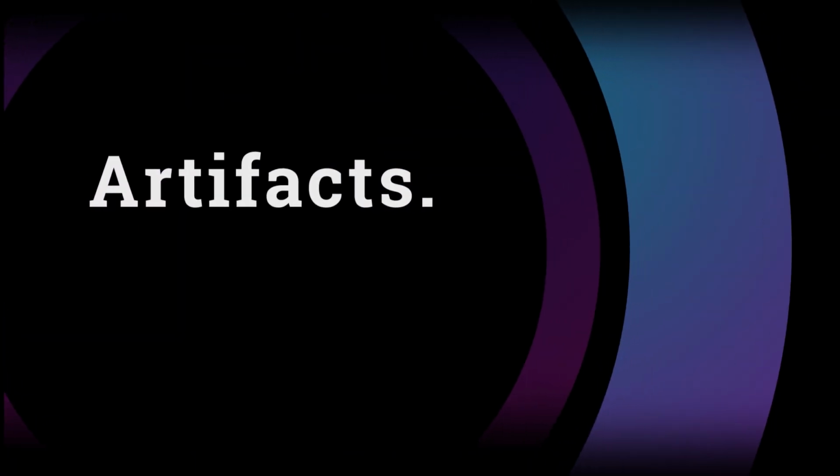Artifacts are any perceived distortion, errors, or misleading images created during ultrasound signal processing. Failing to recognize an artifact exists may make you believe you see something on the display when it actually does not exist. Here, we review the most common artifacts you will encounter in your POCUS journey.